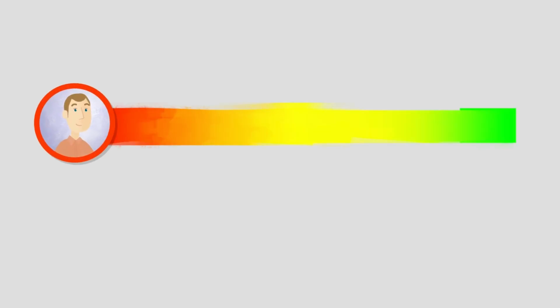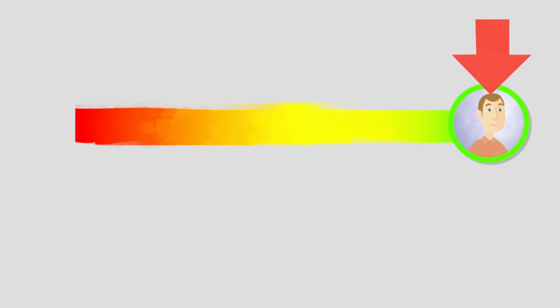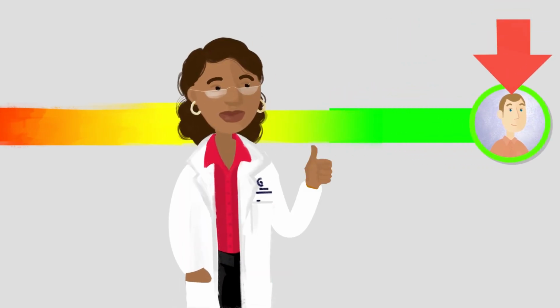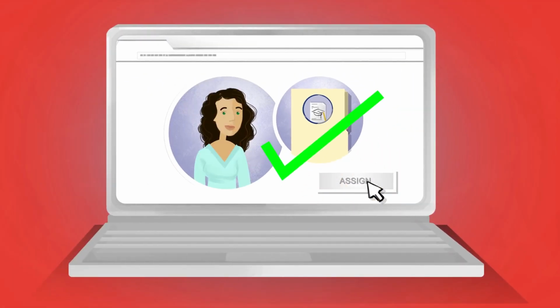Proficiency benchmarks facilitate goal-oriented training. Scientifically based benchmarks are available for reference, but Tammy chooses to set her own for those metrics she thinks are important. Finally, with a click of a button, Tammy assigns learners their simulation curriculum. All is prepared for when the residents start their training.